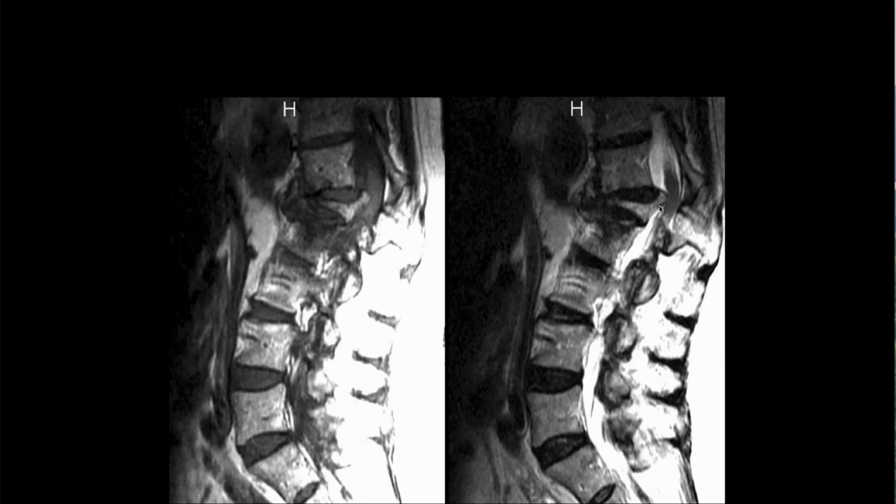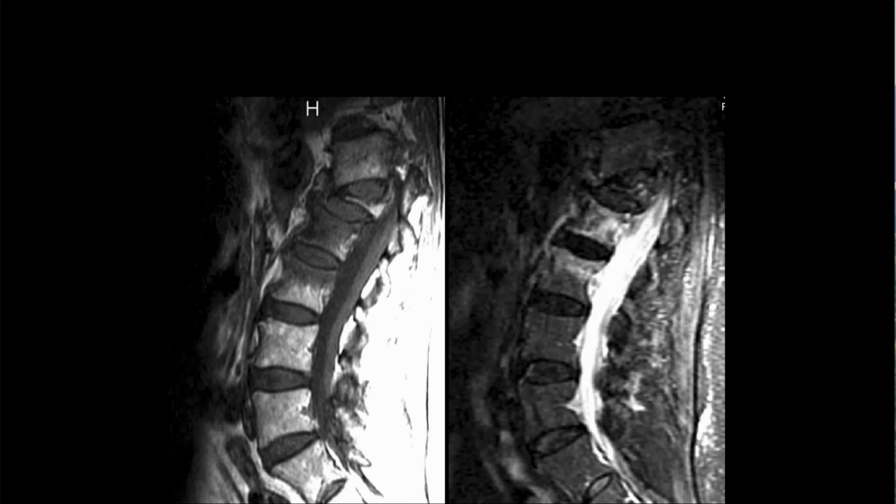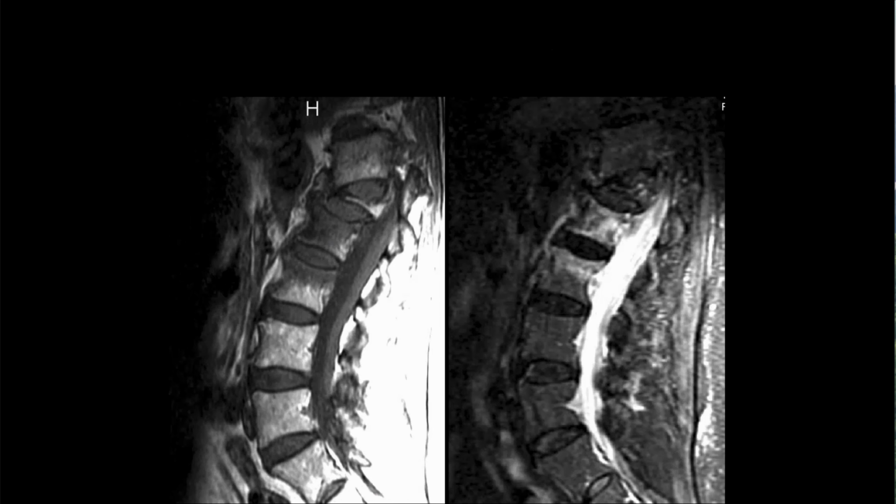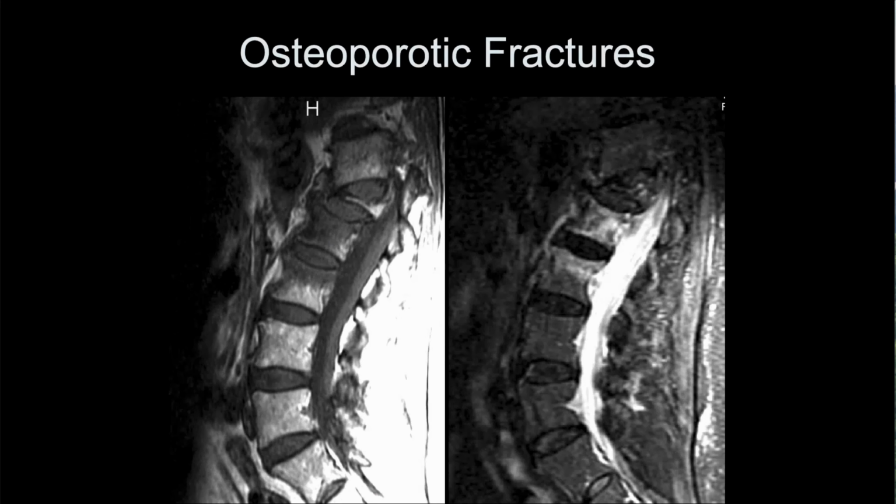Yeah. I think I'd use the term severe compression fracture. I don't know if they have a number for that. And then it looks like compression of the conus here, but we don't see any edema or hemorrhage in the conus at this point, but definite compression. So this is almost certainly going to be a surgical case. We can see multiple levels are involved here.